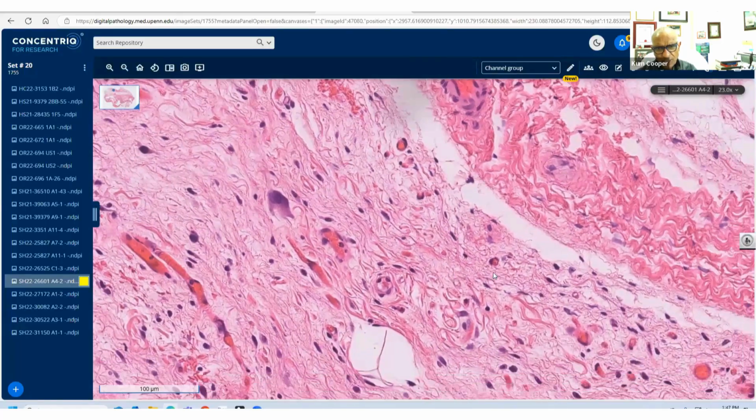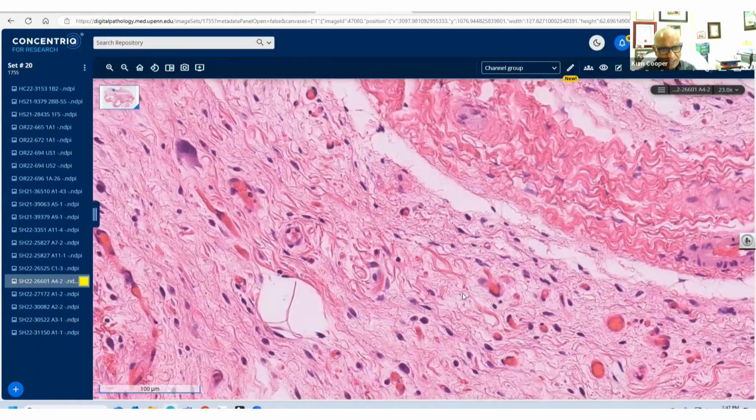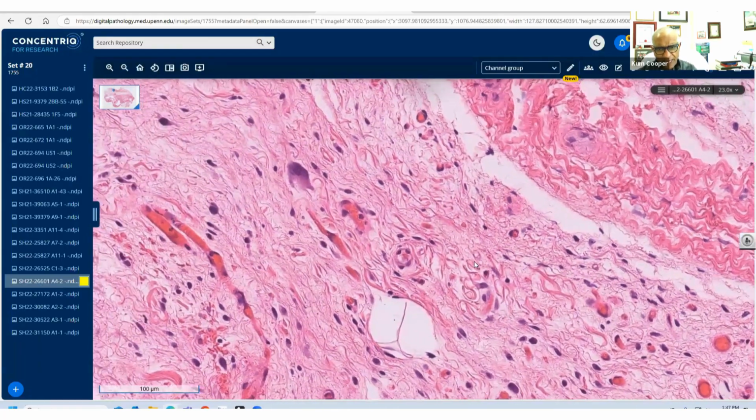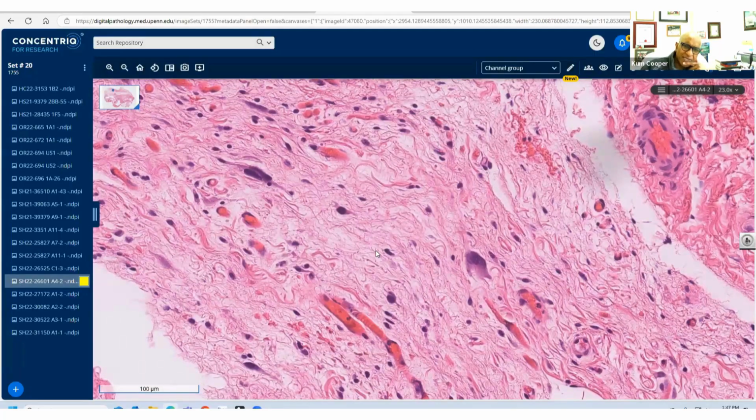some ropey collagen here. You get some ropey collagen. They tend to be a little thicker, but nevertheless, I do like your question, I do. But the fact that you have atypia takes it out of the spindle cell lipoma.